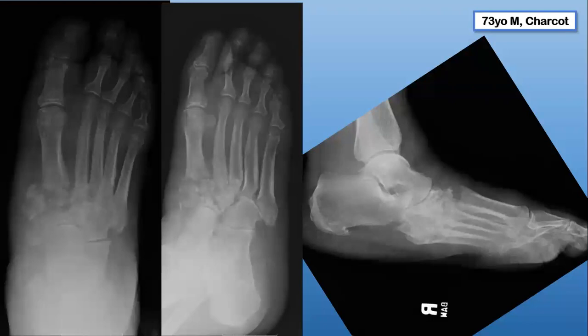Yeah, okay. So fracture at the base of the first metatarsal. Don't see too much else. I don't see anything on the medial oblique, so I don't think any of the bases of the lesser metatarsals are fractured, but it does look like the cuneiforms are pretty much gone. Can't really differentiate between any of them.